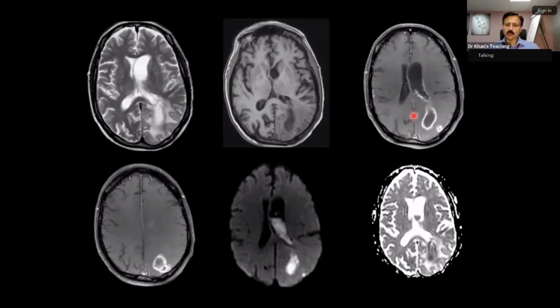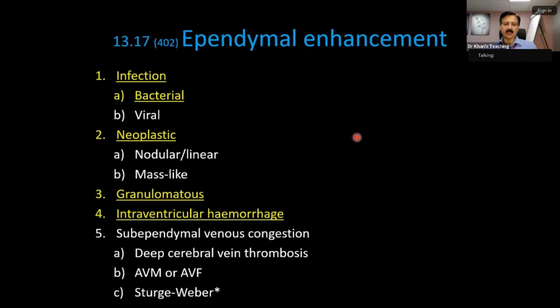Now the examiner will show you this type of scan. If you see here, subtle finding, this is low signal, but this is slightly different signal. And you are struggling if there is a level there. The king sequence here is the DWI, which shows that within the ventricle, pus is sitting there. Actually, there was a parenchymal abscess, and you can also see the ependymal lining, which is enhancing. So the idea was to show you ventriculitis, ependymal enhancement.